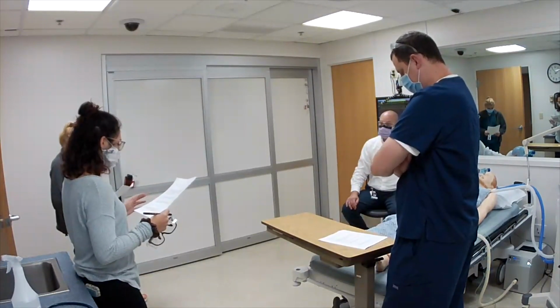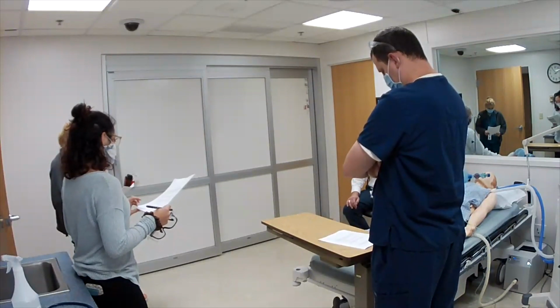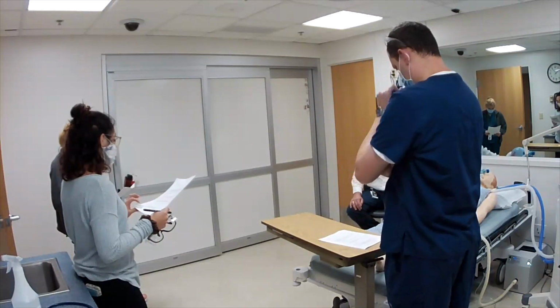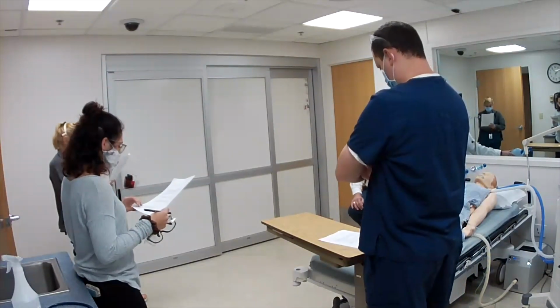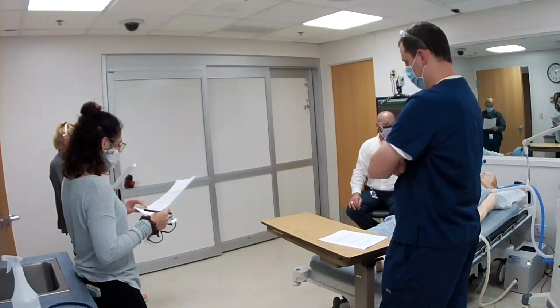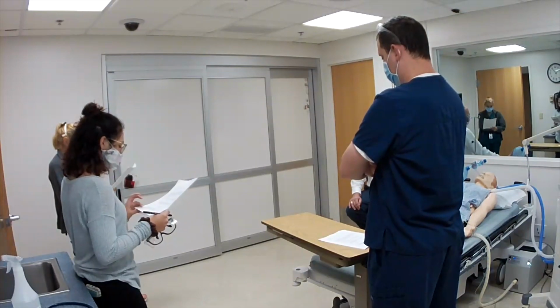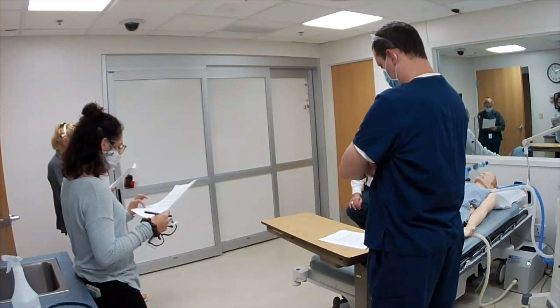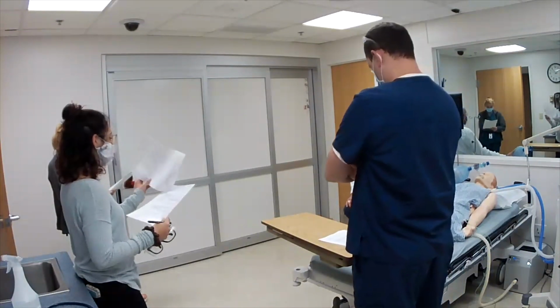Overall objectives: to provide the student with a deeper understanding of ventilator parameters, and to provide the student with a deeper understanding of basic respiratory principles by providing applied exercises combined with discussion. Part 1. Introduction to monitoring and normal parameters. To become aware of the monitored values, emphasizing the respiratory variables. To become aware of which values indicate that the patient is in distress. To understand that the ventilator settings affect many variables. To become aware that some values are measured and others are derived.